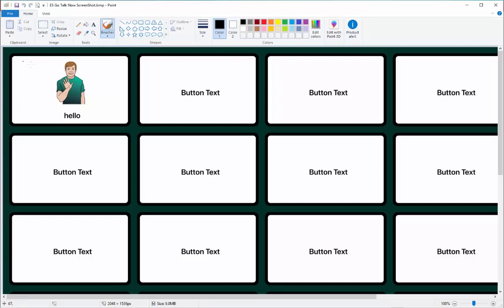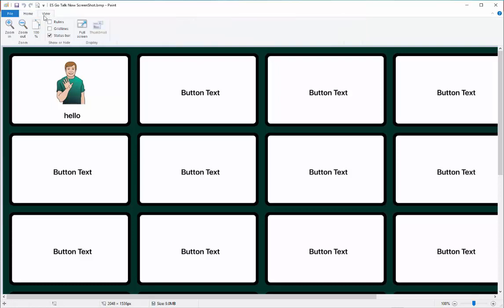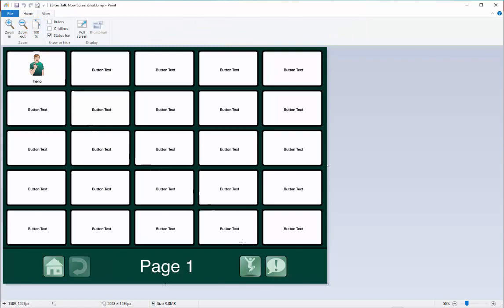So if I move my cursor up to the upper left corner, they'll get smaller and smaller until they eventually go to 0. It's hard to position it exactly at that point. But they get smaller as you approach this upper left-hand corner, and they get larger as you move to the lower right-hand corner. And in this case, I can't even see the entire screen. I would have to change the view to shrink it. And now I can see the entire screen. That's another good thing to check, to make sure that your screenshot captures everything available in the screen area.